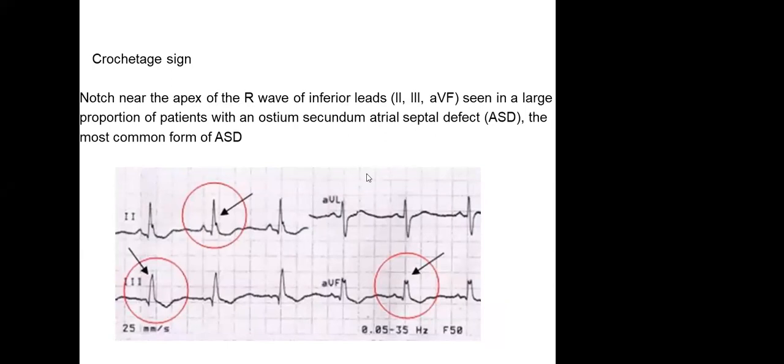Most of us who are doing any kind of physical activity are now being asked to go ahead with the ECG. The Brugada type 1 sign is one thing which you should watch for in an ECG done at an age less than 45 years. Adolescents definitely, 30 to 40. If you are doing it for yourself, then the Brugada sign is one thing you should look for.